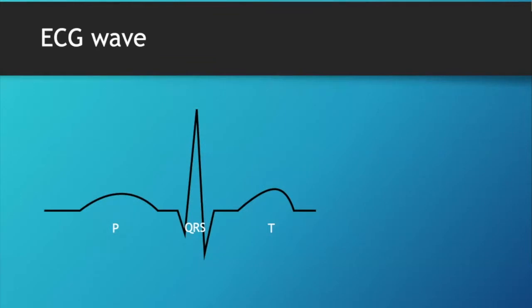Okay, if it's making sense, why does the P wave look the way it does and the QRS look like this? I thought it should be the same. The ventricle is slightly more in volume. It should just be a bigger wave rather than this weird shape. Yeah. Hello. It's a very good question, Ahmed. Thank you. I tend to throw good questions along the way. That means I don't know the answer. Okay.